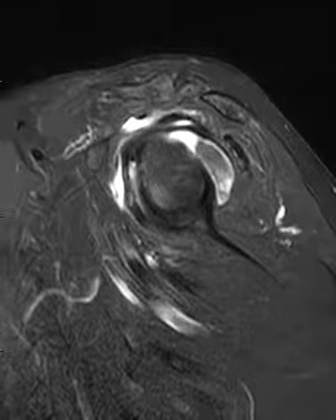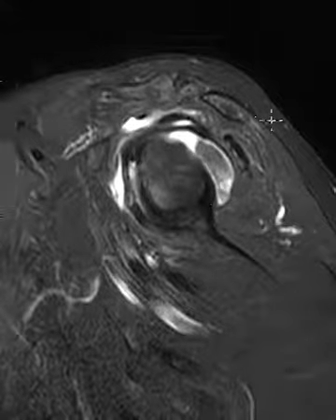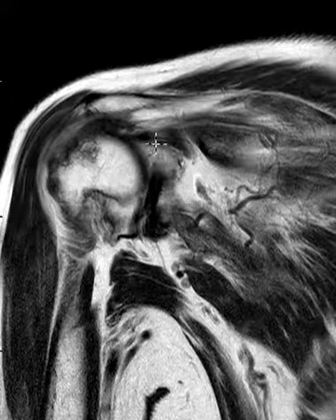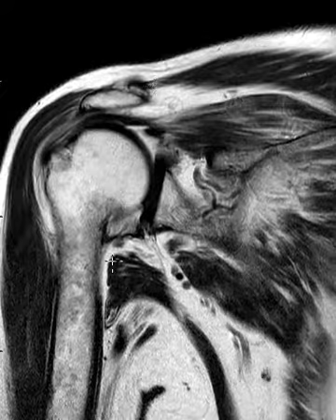And now we're on a sagittal STIR sequence, and here's the process in the posterior joint, and that also looks like fat on this sequence as well. And then lastly, we have the T2 weighted sequence, and we see it back over here, and it also looks similar to fat. So since it's similar to fat, here it is right there on all sequences.